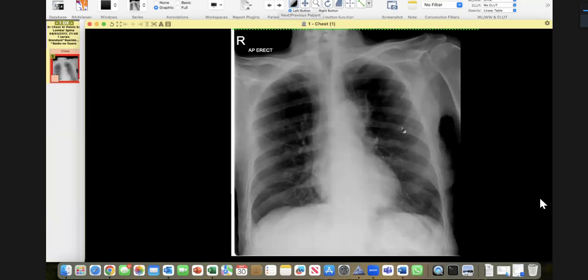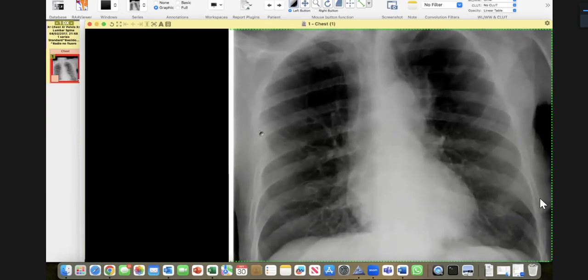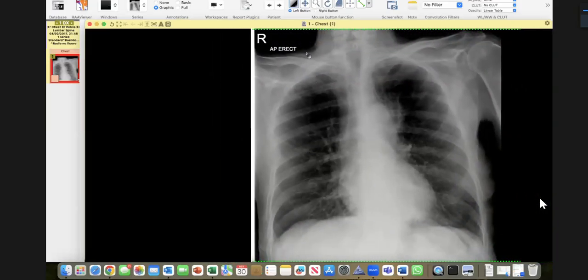In this particular case, first of all, there was something wrong here, but particularly when I had told you to look at the ribs, one feedback will be to always ask to change densities. You can even ask for a magnified view and things like that. If you see here, this is gone. You can actually see it. You could see it even on the other window. You can see that this rib is coming, this rib is going like this. Here, the rib is destroyed. So this was visible on the CT.